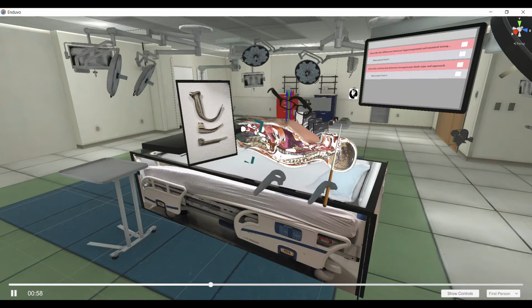If I can direct your attention to the anatomic model, you'll see the epiglottis here with the vallecula just above. And through patient positioning and direct laryngoscopy technique using those blades, the intubator will obtain a direct view, a direct line of sight to the vocal cords and the glottic opening to allow intubation of the patient, or at least that's the goal.